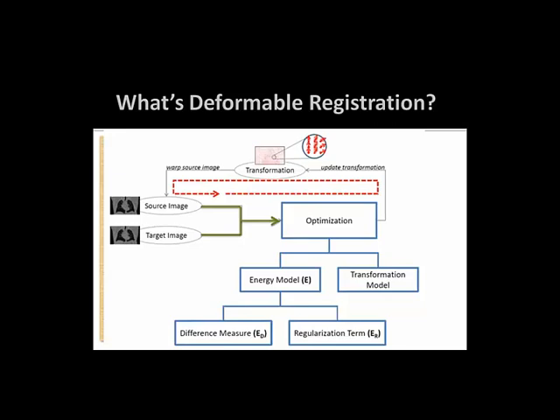Then you go through, apply a slight transformation, and then come back and compare how the transformation, moving the source image, affected the target image. So again, now we match those two after the first movement, and then we decide, is this measurement better or worse than the previous one? And then it keeps going in that iterative process where you take a measurement, move it a little bit, and then come back and compare. Move it, transform it, and then compare. All of this is to get down to a baseline movement until it basically says these two images are as good as they can get, and then the transformation stops.